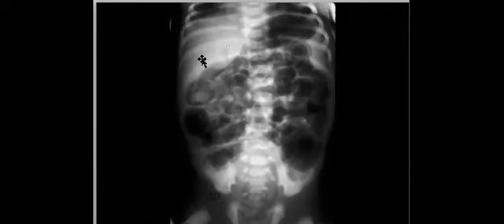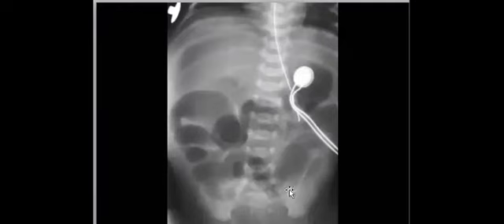concentration will be to look for portal venous gas. So in the first approach, if you find any free air, go directly to see if there is any portal venous air. Okay. So yes, necrotizing enterocolitis: any free air in the abdomen, your differential will be necrotizing enterocolitis.